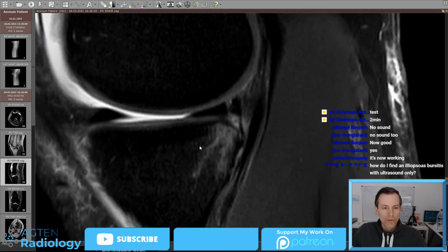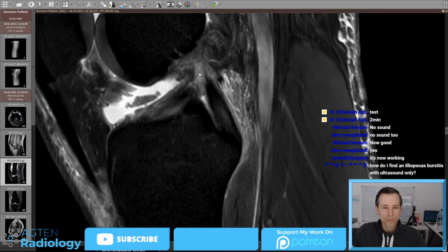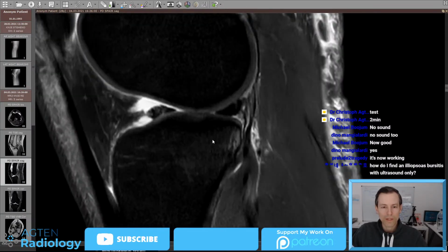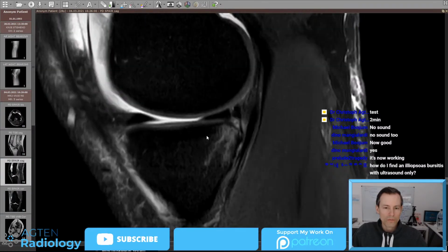Okay, then as with a suspected ACL injury, let's just establish the ACL injury first. So ACL completely gone, but we will see that just here in a minute. We have the expected bone bruising and the impression here on the posterior or posteromedial corner of the tibial head with the corresponding bone bruising.